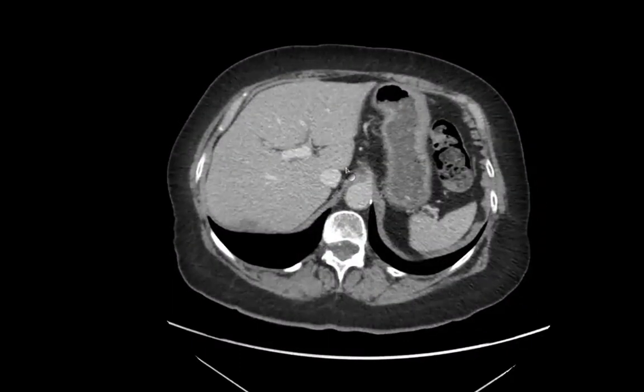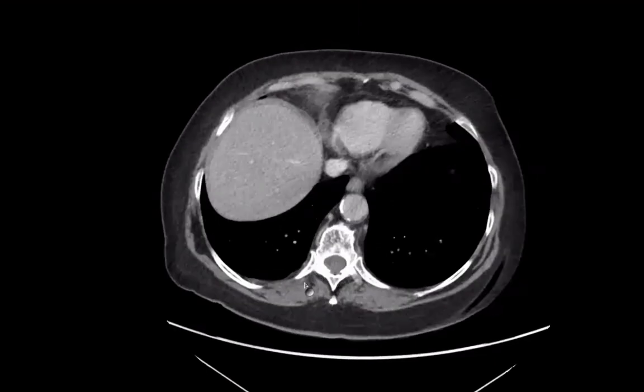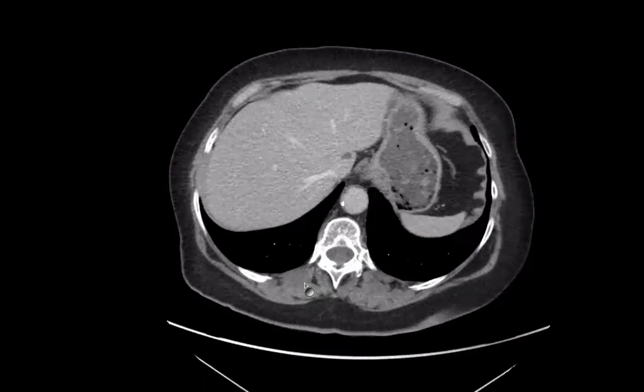Now, I'm just interested to show me the liver lesion. Where's that liver lesion you were talking about? This one here. Okay, so it's not a liver lesion. So what do you think of this lesion? It could be a pseudo lesion because it's coming at the interface with the diaphragm. No, the one I'm showing now.